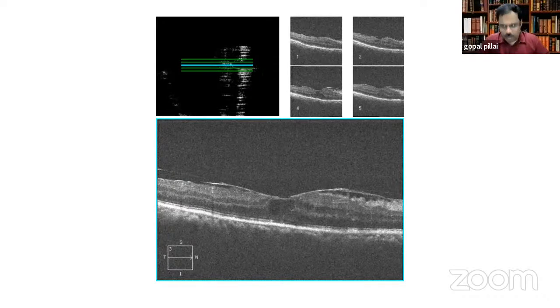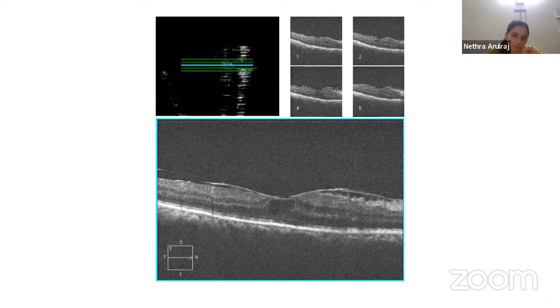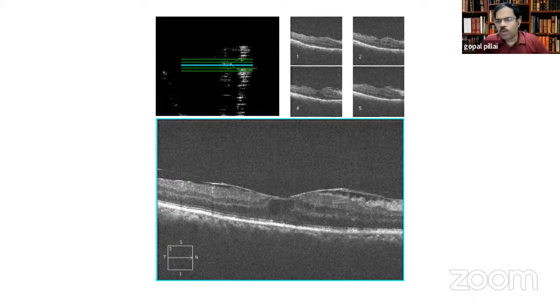Okay, so you mean to say that it starts with outer retinal thickening, is it? Yes, sir. Outer retina generally does not get thickened. Minimal. Outer retina is the layer of the rods and the cones and the retinal pigment epithelium, etc. That doesn't get affected in an epiretinal membrane. Only very late degenerations occur in the outer retina when the epiretinal membrane has been there for a long period of time.